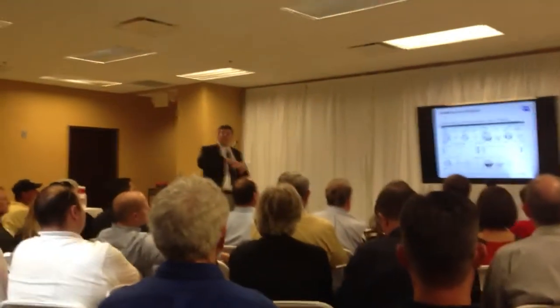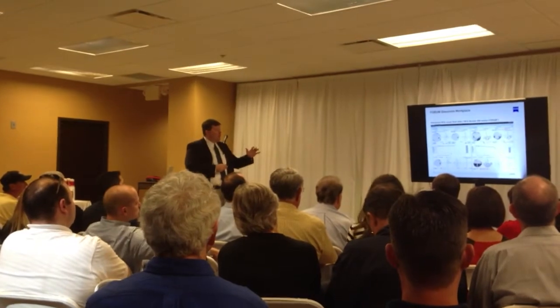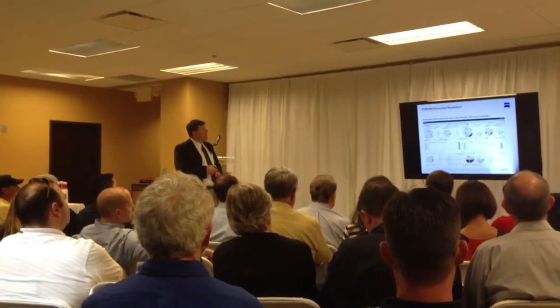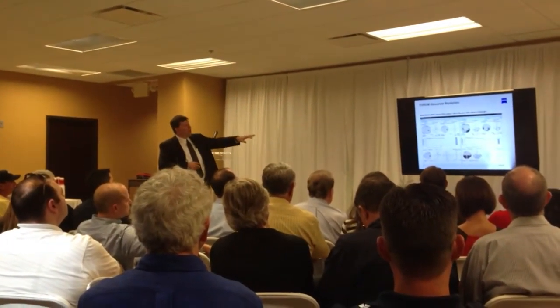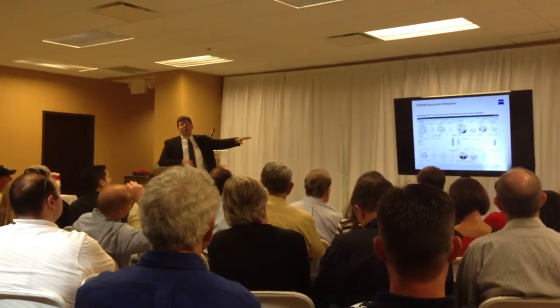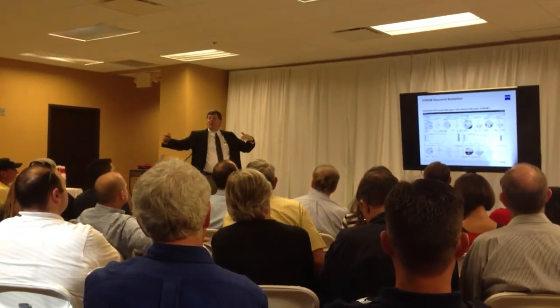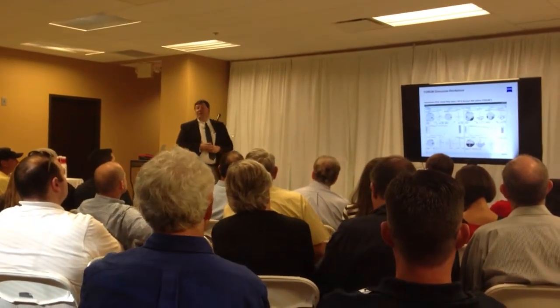VFI, which is really an overall trend analysis report. But you can see here you have the visual fields. And one of the other things you got to keep in mind is that with the VFI, using the guided progression analysis, you can actually predict, at the rate of loss that they're having, what it's going to be 5 years from now. And that can be very helpful.